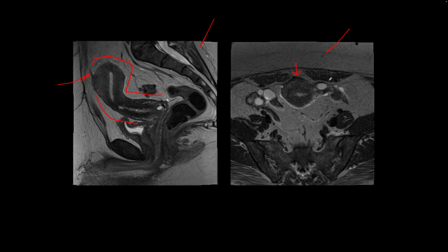This is something which is commonly seen post C-section, and this is one of the complications of C-section, where after they undergo a C-section, the uterus gets adherent or attached to the anterior abdominal wall, and on imaging it seems like it's been pulled forwards and rotated like we see here. Usually it's just an incidental finding and I'm not aware of any symptoms that this can cause.